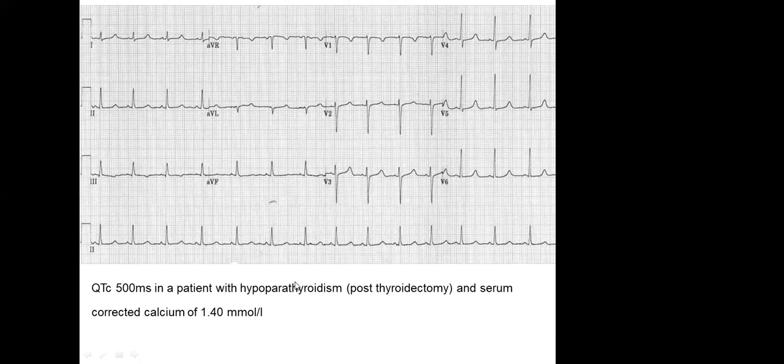My recommendation is, if you have a thought while looking at a long lead 2, you see that the QT interval is approximately half of the RR interval. Rather than jumping on calculating square by square, take the number of squares and use the MD calculator. It will save you more time, and you can use that time to review.